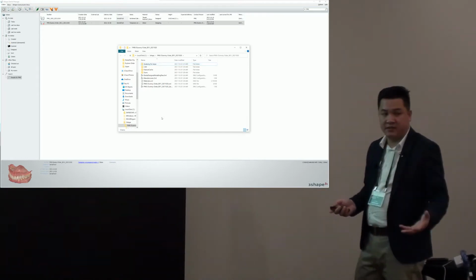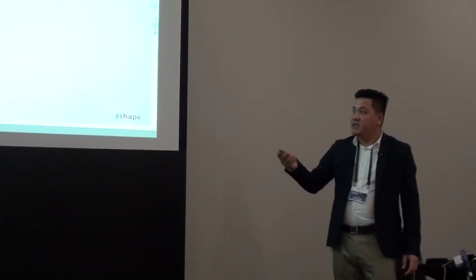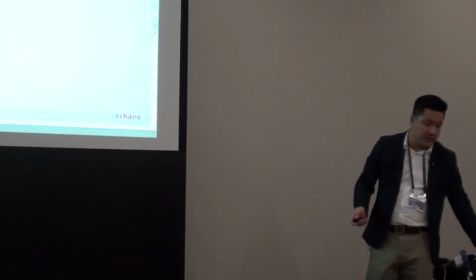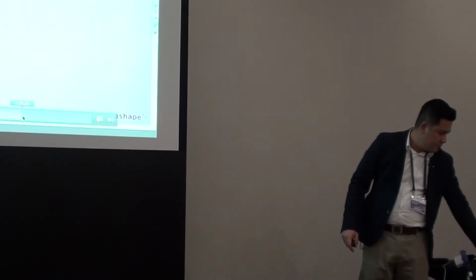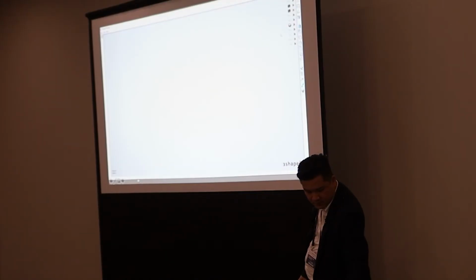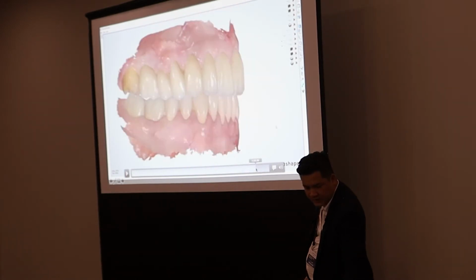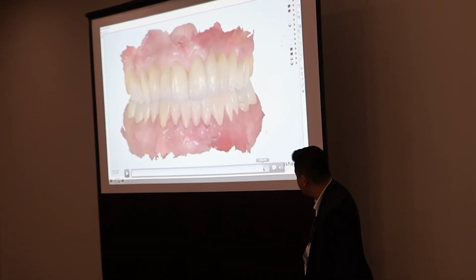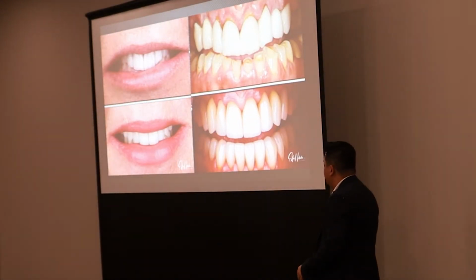What this does is it tells the software that we want to reuse our old design and alignment and everything like that. I don't have a design video of this, but I have a quick summary of it. Basically, you bring it in, mark your margins, and at this point, when you get to the design phase, it'll bring up your anatomy for reuse, and this is the final finished product here. Essentially, it makes very short work of this. You've already done the design. Maybe the final design will take you another 20 minutes. And this is the finished product for that case.